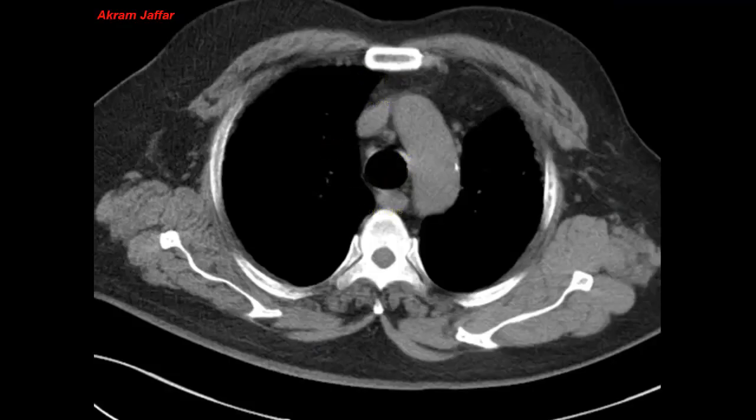This section is almost at the same level. It's an axial CT, almost at the same level as the anatomical section. So here's the sternum, and this is the superior vena cava on the right side, and the arch of the aorta heading toward the left side, and here's the trachea, and behind it is the esophagus. A vertebral body, a costovertebral joint, a transverse process, another transverse process, and a costotransverse joint with the tubercle of a rib. And this is a spinous process and a vertebral canal. And of course, this is the scapula, which can be seen here.